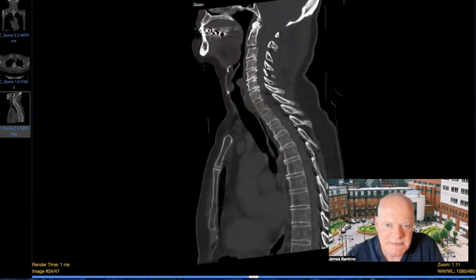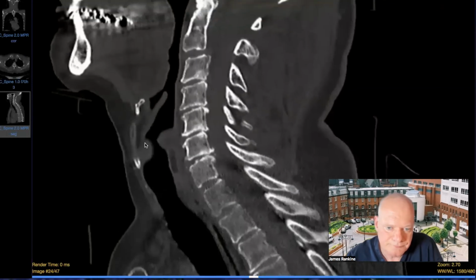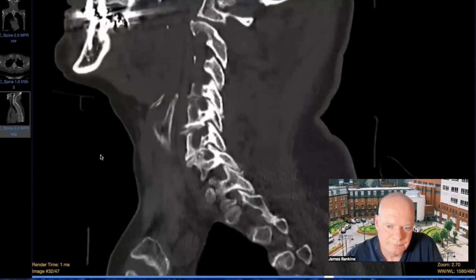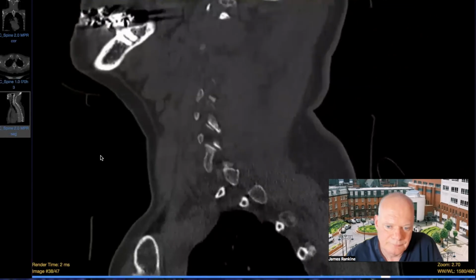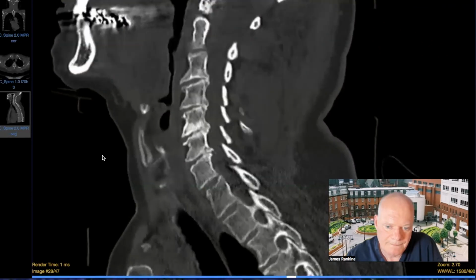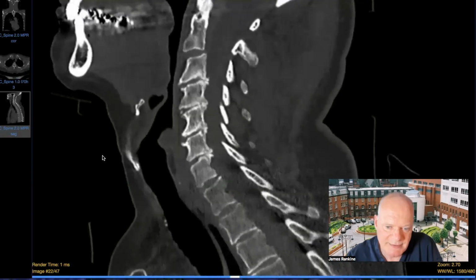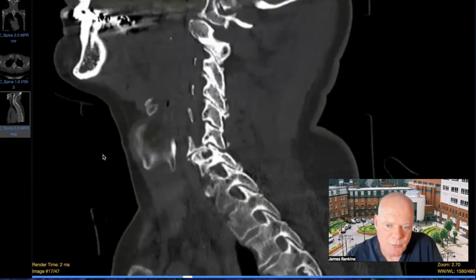And see what you think of this. I'll just zoom this up. And I think if you've looked at these cases already on the website, you'll be at an advantage here, because this is quite a difficult case.